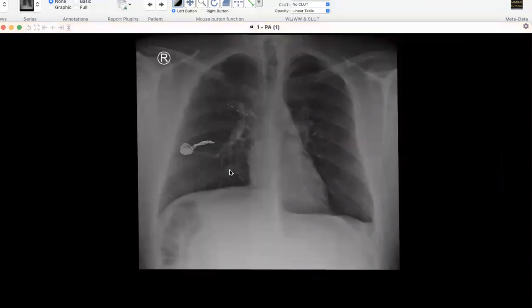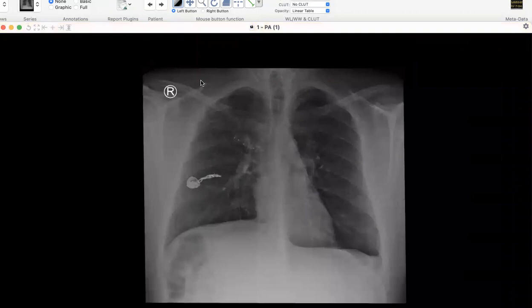Here, this is the post-embolization film for this patient. They have only coiled the feeding artery. They didn't put anything in the vein over here, which you can still see. So I had the CT for this patient. I'm not showing it because it doesn't add anything, it's the same, just AVMs.